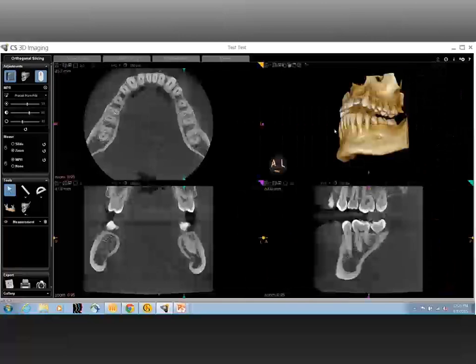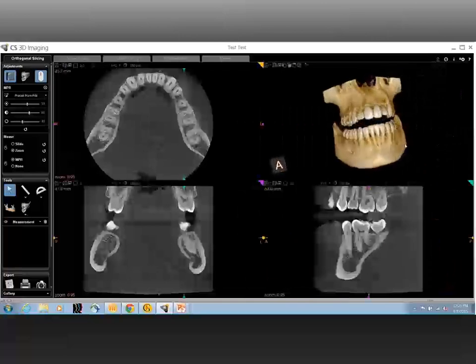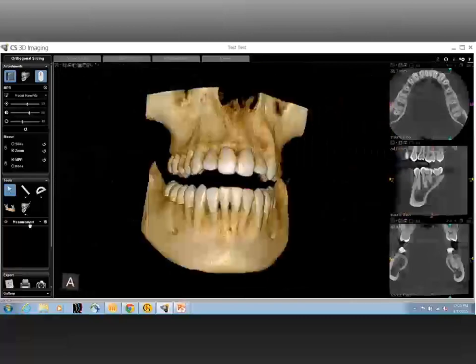To pick up from the previous question, yes, that is absolutely correct. Those are the three things to start with. And of course, as we expand the horizon into interpreting or going through the images, a few things to look for. Number one, the inferior alveolar nerve canal. Everyone knows that that's one of the most critical structures that exists in the mandible.